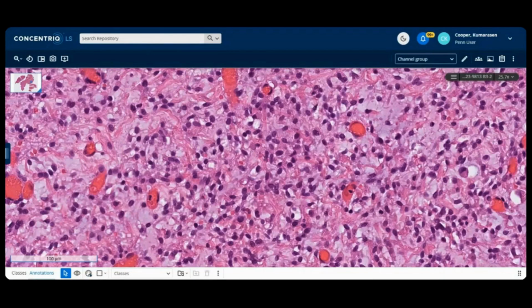It's DNA damage; I know the DD. I forget what the IT is, but that's a gene. It's rearranged from chromosome 12 in myxoid liposarcomas. So I can see the thinking here is myxoid liposarcoma.